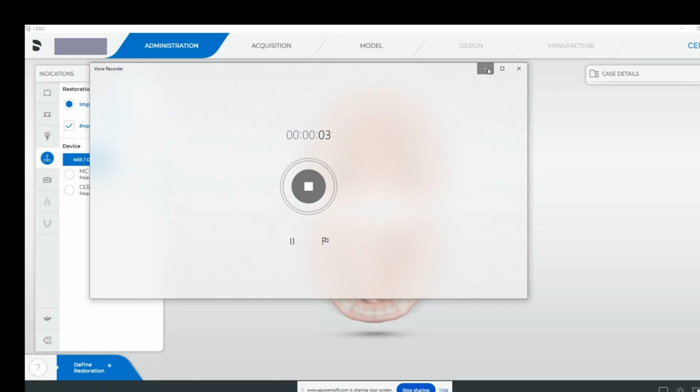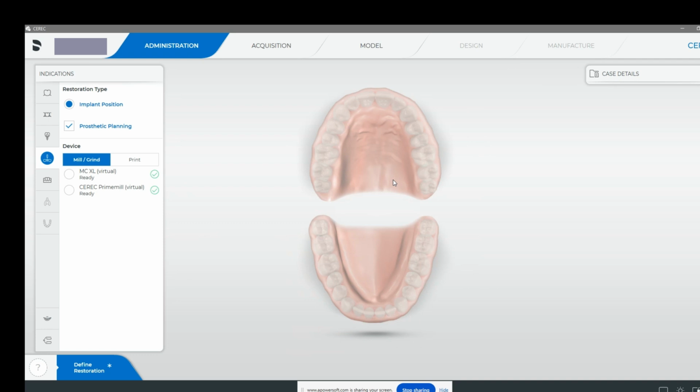Okay, so one of the questions I got asked after the Romexis video went out was, where do you design the crown? And I'm going to go over that process right now. Now remember, the crown that you design on CEREC can't be imported into Romexis. CEREC owns the rights to that, so you can use it in a Sirona product, like their own implant planning software, which hopefully we're working towards. But right now you can't.